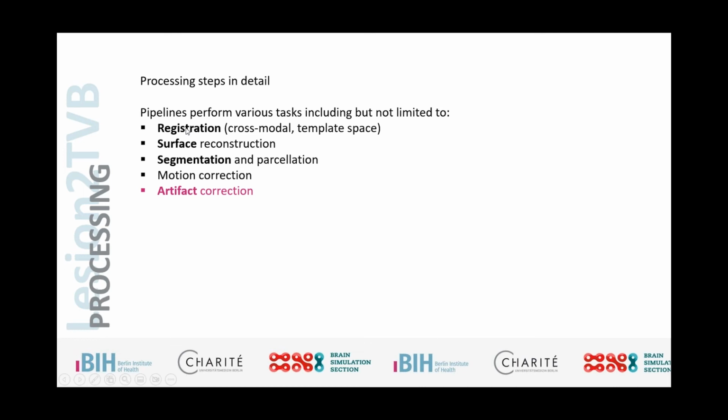The first one is registration, either cross-modal registration. We've seen the different modalities. We want to have a diffusion image, our tracts and our final parcellation in the same space. One is created in the T1, the other one is in the diffusion space. Even though it is the same subject, in the scanner at the same time, one acquisition after another, there's still movement, and many aspects that change the space in which those are acquired, as well as the resolution of the space. So there's a lot of registration needed across the different modalities to make them overlap.